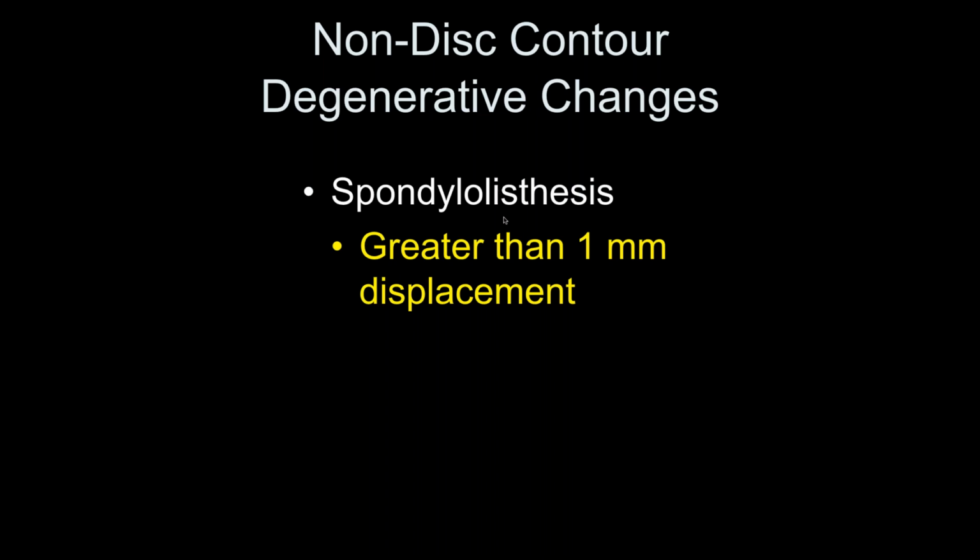Yes. I mean, the extruded disc that gets resorbed then leaves the disc desiccated and decreased in height and everything, and it's a setup for future degenerative change. I would imagine that, if it was just a little bit of a protrusion or something, and the disc didn't actually herniate, then maybe it would look more normal after a year. Isn't that possible? And it would be less degenerative change in the longer term. I don't think I've ever seen a disc look less degenerative over time. There always seems to be a progression to more degeneration, regardless of the herniation. Yeah.